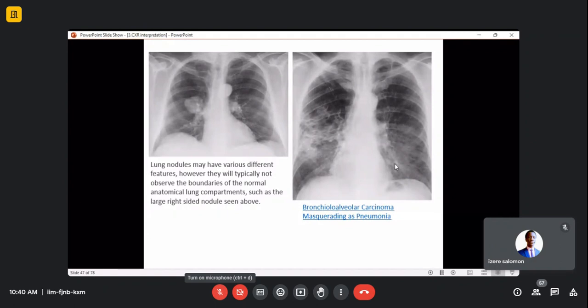No, immediately I think of chronic disease. There is no consolidation that can be there for 6 months or 3 months. Okay, is it okay? Good. That's how we approach these different opacities.